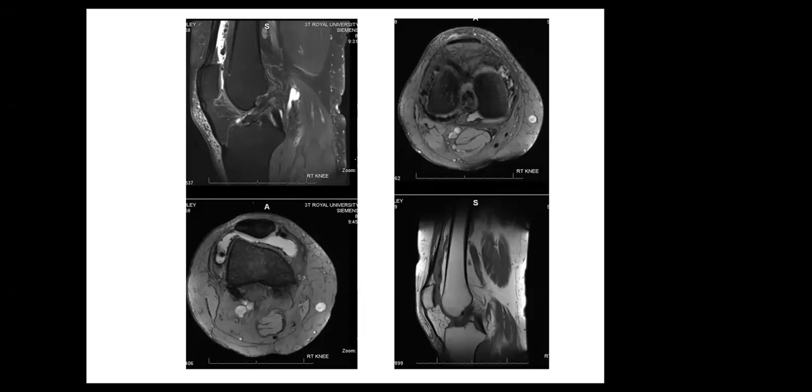Okay. Another finding: there is soft tissue swelling anterior and posterior, no other compartment. Okay, so your time is up.